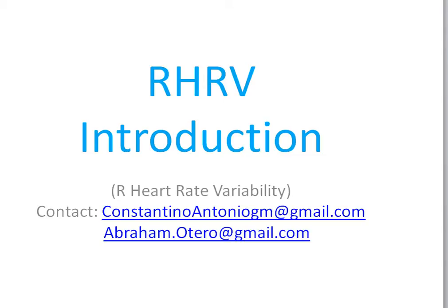Welcome to this video tutorial about RHRV, R heart rate variability. RHRV is an open source package for the R environment which provides support for performing heart rate variability analysis from the RR time series. It has support for performing analysis on the temporal domain, on the frequency domain using both Fourier and the wavelet transforms, and nonlinear analysis.